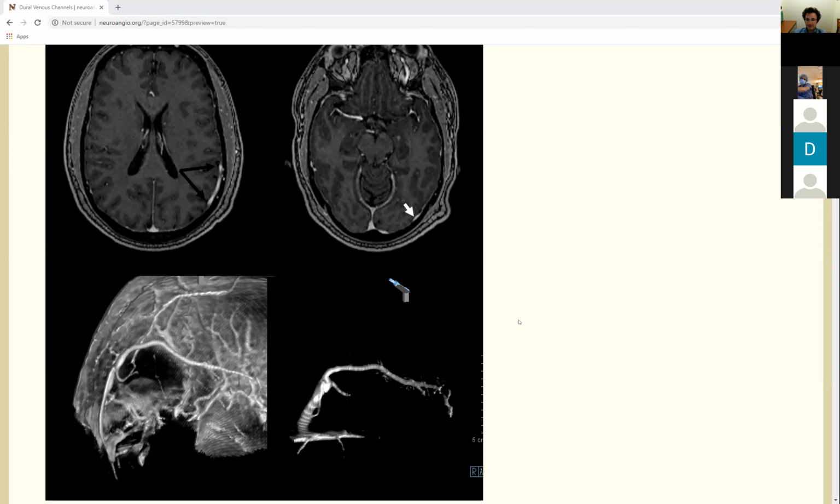I guess, if they have enough resolution to understand it. Maybe. How would you distinguish it from a meningeal vein? Yeah, what would be the difference? Is there a difference? A middle meningeal vein, the tram tracking of these things that we see, in normal anatomy, is there a difference? Is that how meningeal veins are anyway, right?